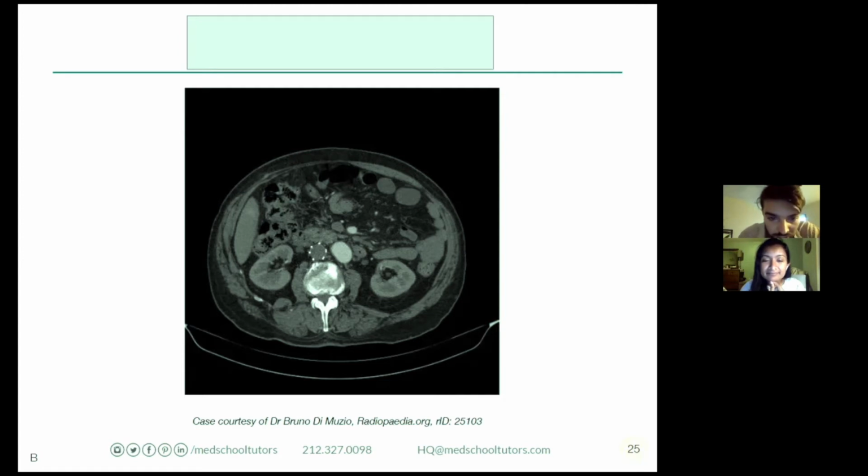And again, I'm looking here at my vertebral bodies, and those are going to be the most white, the most radio-dense part here, and that's significant for a hard thing like bone. And just anterior to that, I see my aorta. It looks like I have some kind of aortic calcifications. My apologies, I said my aorta, and then my IVC. Would that maybe be an IVC filter then?